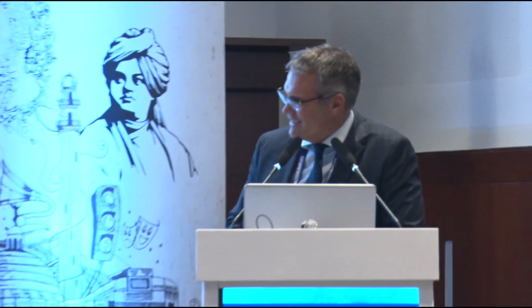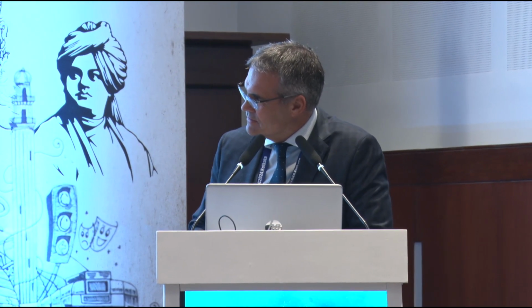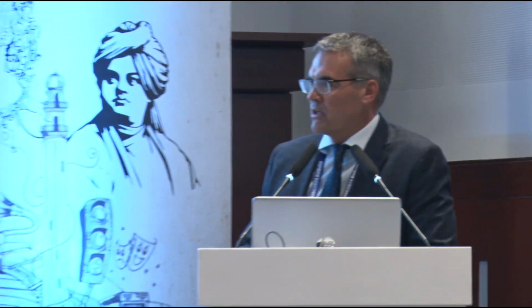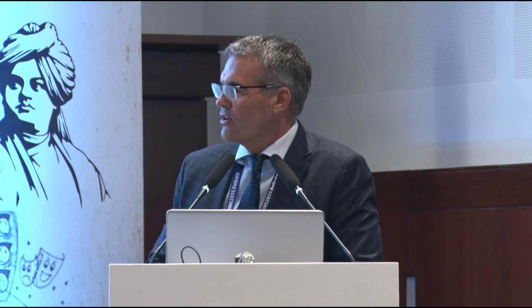I saw a lot of your autofluorescence and infrared imaging. What would be your best indications for autofluorescence versus red-free or infrared imaging? I do autofluorescence routinely on all my cases, which are tumours and vitreoretinal cases, but mainly talking about tumours. As for red-free, I don't use it very much. Okay.